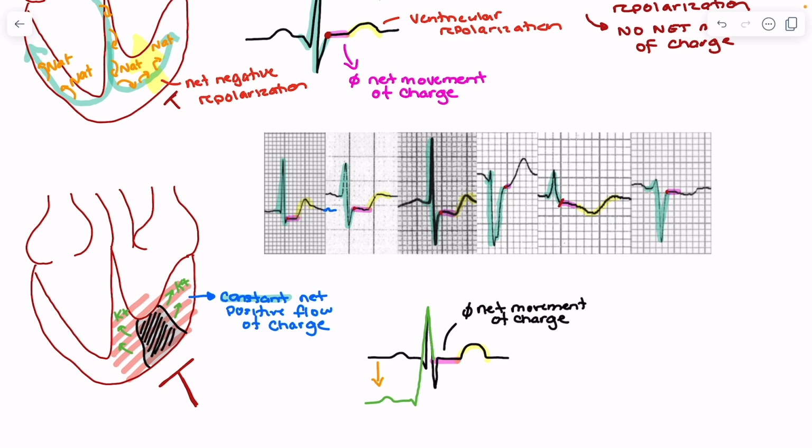So when we're looking at ST elevation on a 12 lead and we're trying to find elevation on a 12 lead that would indicate infarction, I'm looking for that change in baseline, but it's still going to be characterized by that J point. So at the end of the day, the core thing I'm looking for is, when do I stop having positive and negative deflection from my QRS complex, and where does that period of rest start, which is going to be right here. So when I'm looking for ST elevation on my 12 lead, I'm still just trying to find that J point.